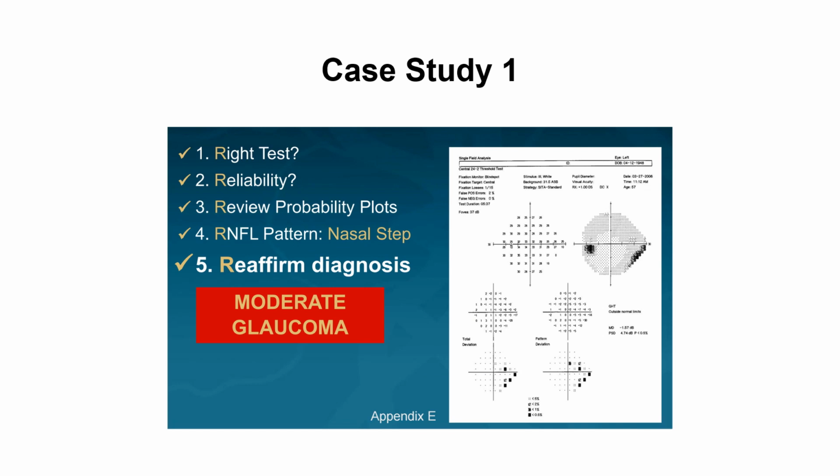This is moderate glaucoma, okay. And you can look for the other parameters we mentioned here: the glaucoma hemifield test outside the normal, the mean deviation, and the pattern standard deviation. If you watch this YouTube lecture, you will be able to explain every point in this printout.